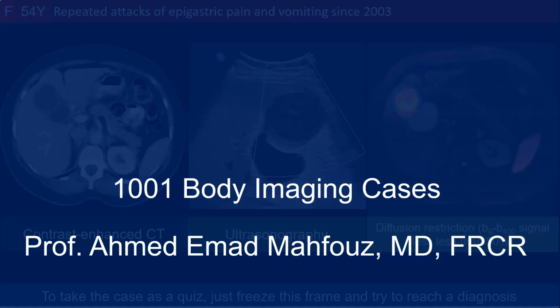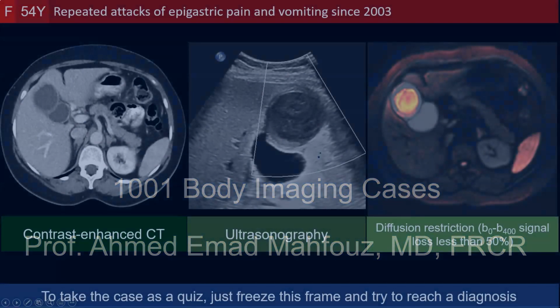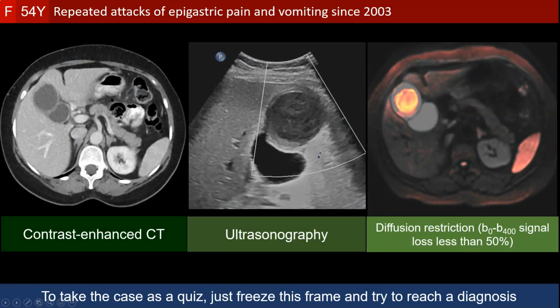Welcome to the body imaging cases. This is a 54-year-old lady with repeated attacks of epigastric pain and vomiting since 2003.